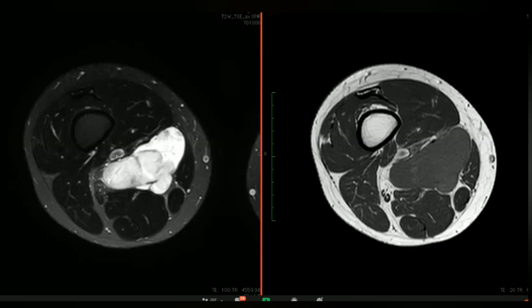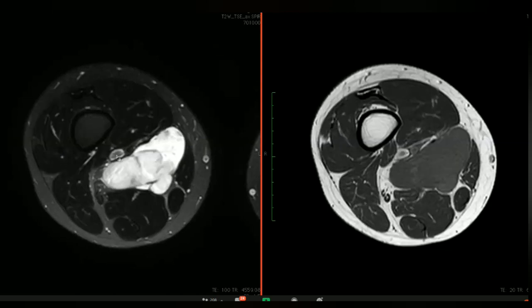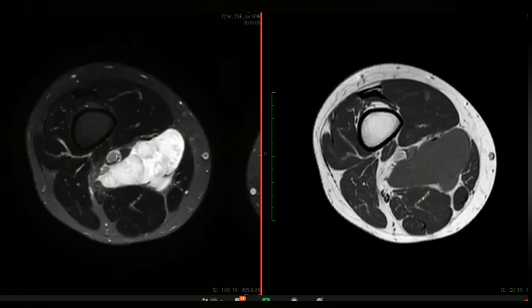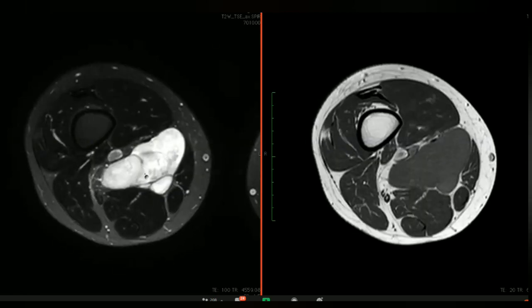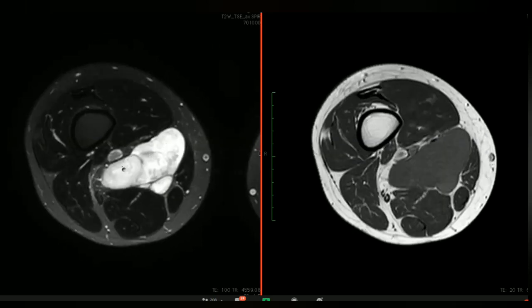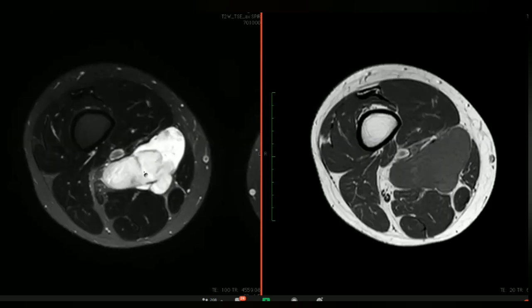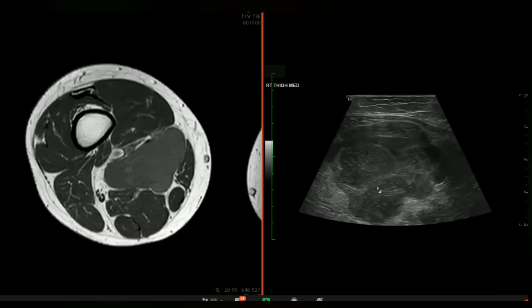How did you come about that? Sir, because I can see lobulation and sort of internal septations. Well, they're not septations, it's part of the lobulations of the mass. They're not really like septations. But this is not really fluid density, is it? It's looking solid. Some component is solid. Yeah, solid. Now, obviously, it's a solid lesion, and your ultrasound was there to help you, wasn't it? The ultrasound told you that this is not a fluid lesion; it's a solid lesion. So you've got a solid lesion.